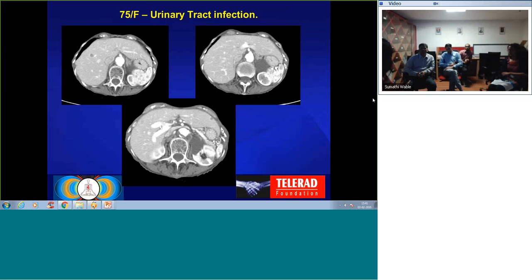The patient had a humeral lesion, on CT or MRI, I can't recall. It was a fairly sizable lesion in the humerus, and it enhanced just like an HCC. It just lit up, it was so vascular. We said it was a metastatic HCC lesion.